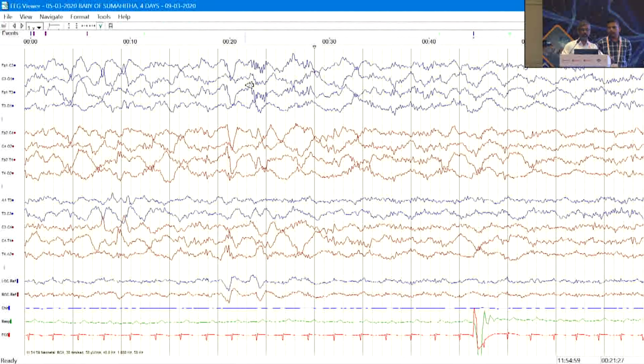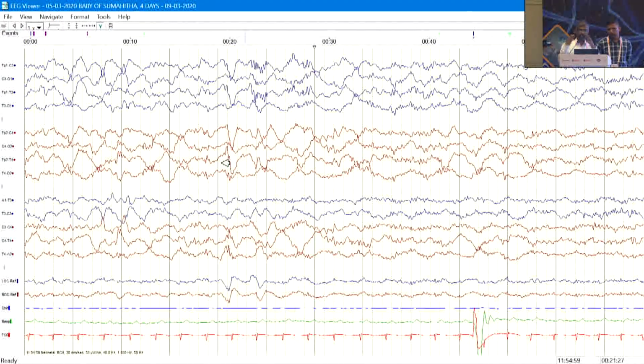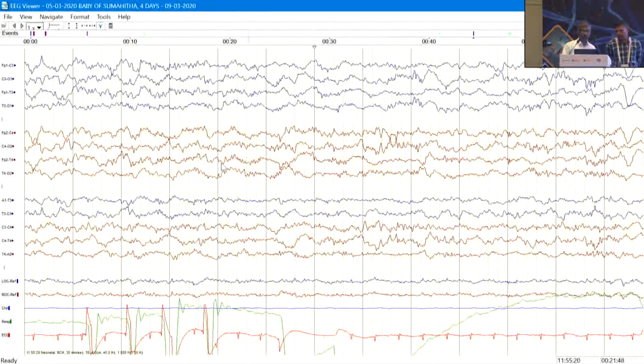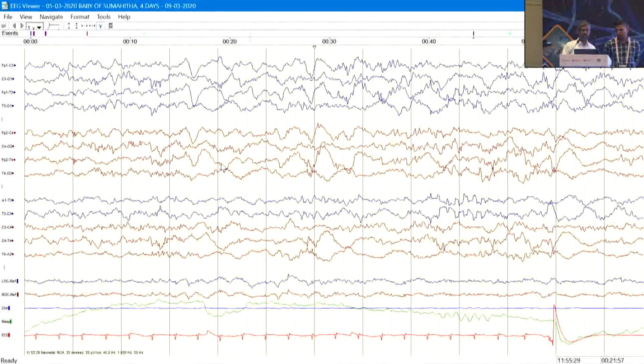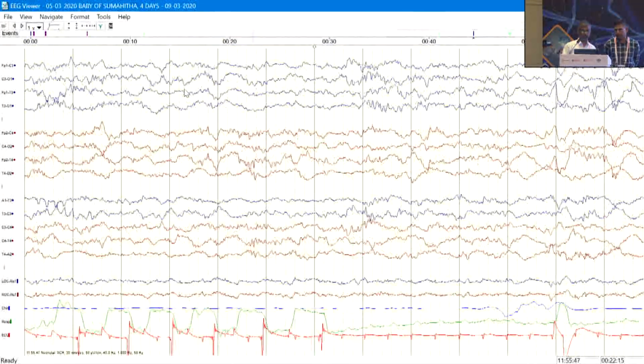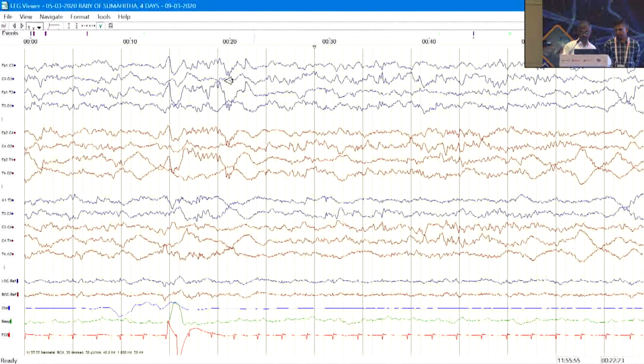And if you see bilaterally, all the waveforms, whatever waveforms here, you can see waveforms here, right and left. So this is a synchronous symmetrical EEG. So that is another important aspect that we will describe. So I'm going forward to see if there are any periods of discontinuity. This is another frontal dysrhythmia and frontal sharp wave, which are normal. So this is another page where you have frontal sharp transients.